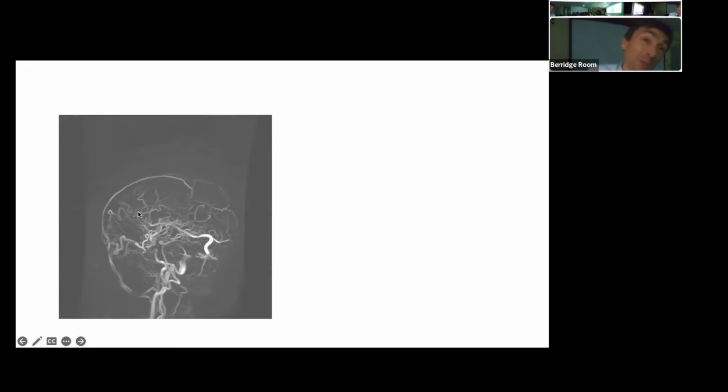I suppose this is useful for what you can't see really. So this should show the sagittal sinus in the midline going around the top of the cerebral hemispheres, and you should see a straight sinus and maybe some internal cerebral veins. But here you can see arteries coming up from the neck.